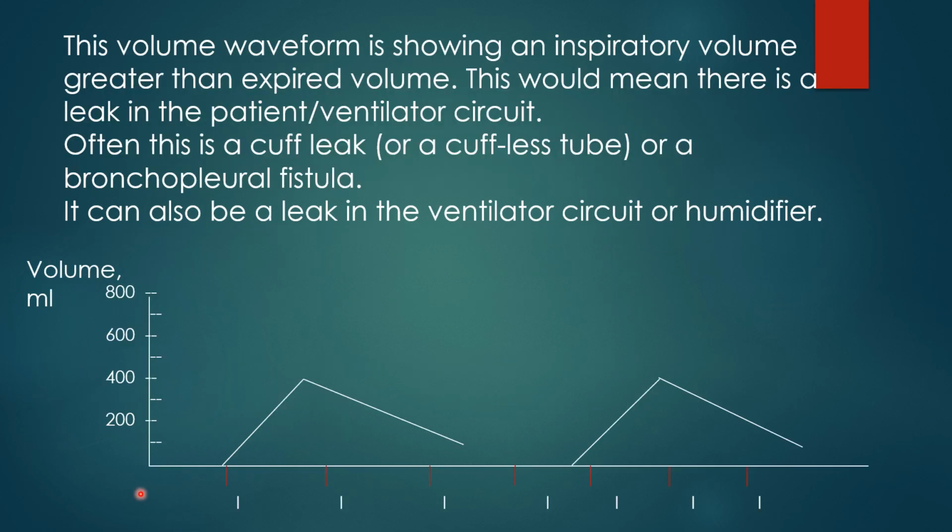This volume scalar is showing that the volume on inspiration is greater than the volume on exhalation. 400 milliliters go in, but when he exhales, it doesn't come back down to zero. So that means that about 100 cc's of the tidal volume was lost somewhere.